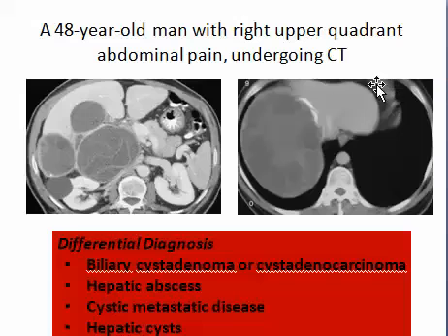Here we have one cyst that is well defined with a calcific outline, and you have a lot of cysts inside. This is the typical appearance of multiple daughter cysts, and here there is one cyst with a separate germinal layer from the cuticular layer, and they are more than one, even involving the kidney. This is hydatid disease.